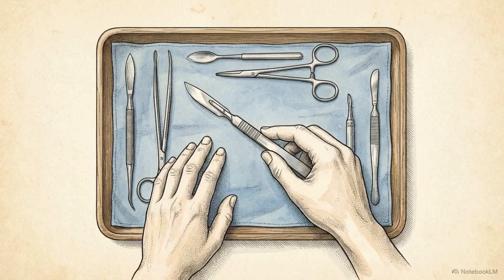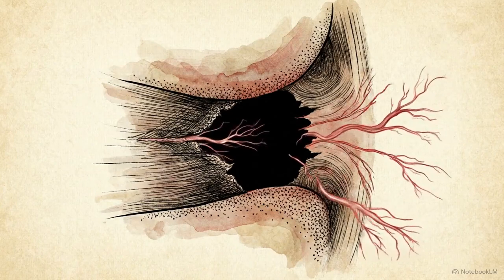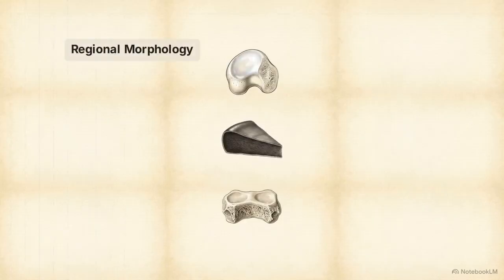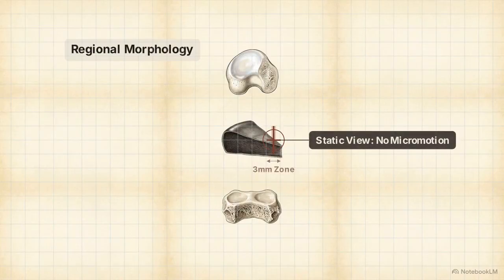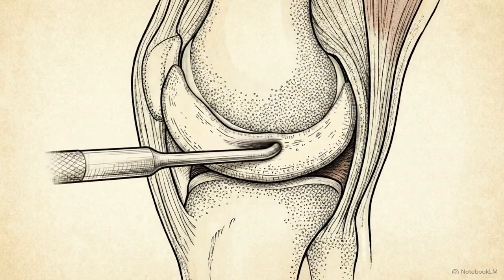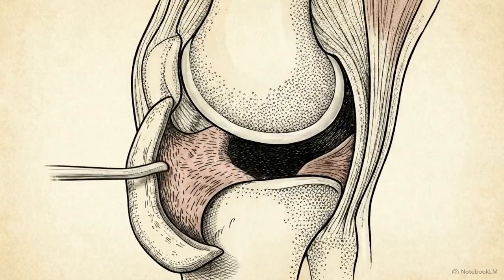Not every meniscocapsular injury flagged on MRI requires a surgical fix. Recognizing the architectural signs of spontaneous healing prevents surgeons from undertaking unnecessary arthroscopic exploration for lesions that are already stabilizing themselves. Ultimately, MRI is a static tool. It maps the regional morphology with high precision, but it cannot definitively assess ongoing micromotion or functional lesion stability. True instability, the metric that dictates the need for surgical repair, only manifests under mechanical stress. It occurs when a probe forces the posterior horn to displace anteriorly into the medial hemijoint.